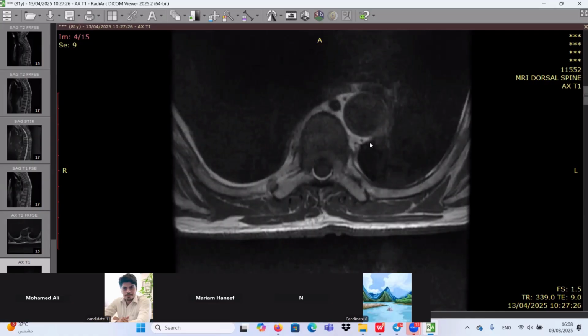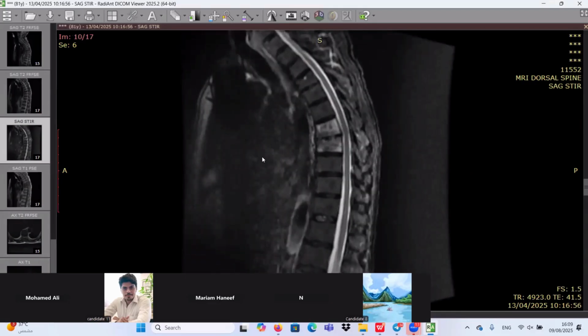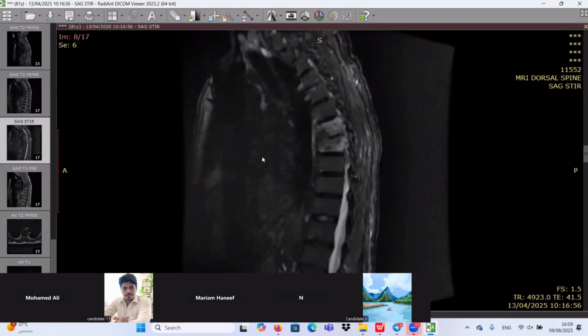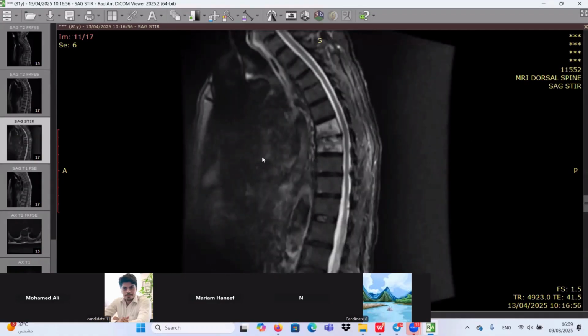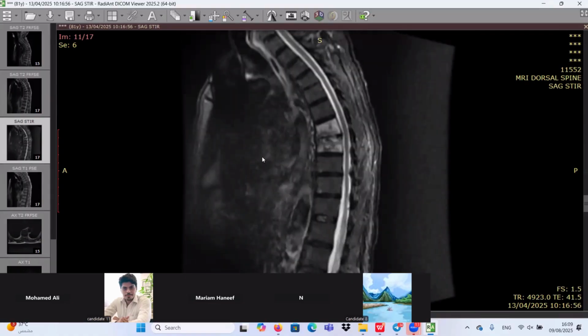What's your opinion here? What's your diagnosis? I think I have differentials. This might be a case of spondylodiscitis. Yeah, very nice. Okay, perfect. Because it involves the intervertebral disc, and I can't see any subligamentous spread or other level affected. So I think this is pyogenic spondylodiscitis.